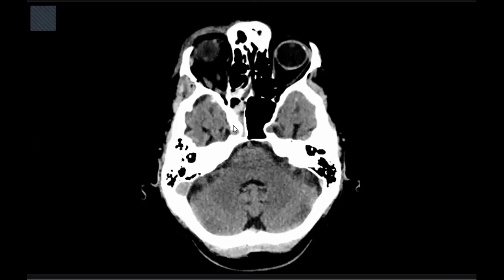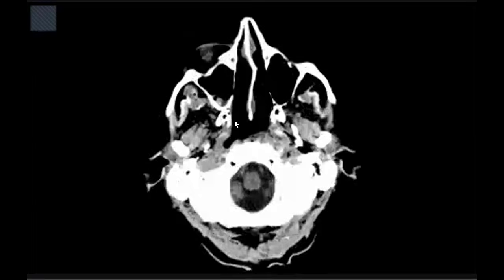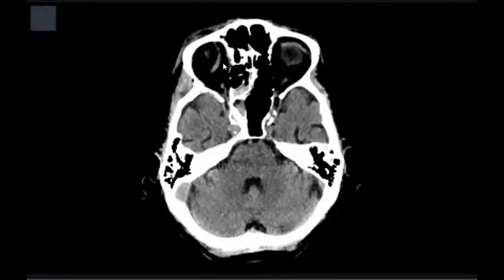So traumatic carotid cavernous fistula is a possibility. You can see here the right cavernous sinus is slightly bulky. If you go through this and find the superior ophthalmic vein hyperdense, you have to suspect carotid cavernous fistula.